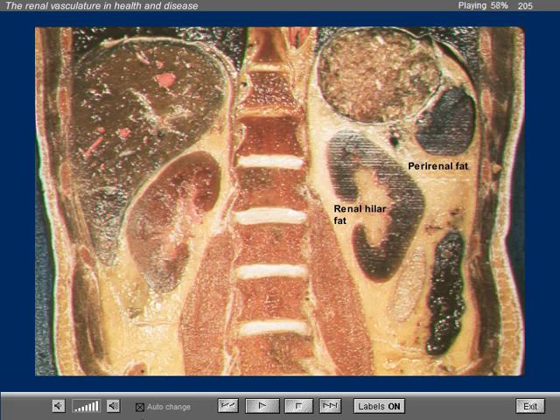As a matter of fact, if we see excessive fat within the kidney of a patient with extrarenal pelvis, we must suspect a pathological condition. Excessive fat in the renal sinus may be an anatomic variation, but also may be seen with inflammatory and other processes of the kidney.